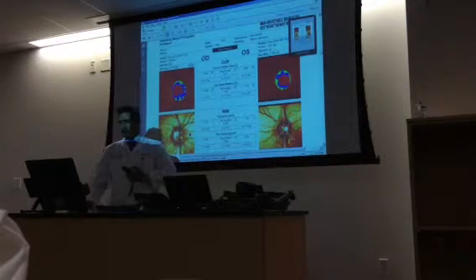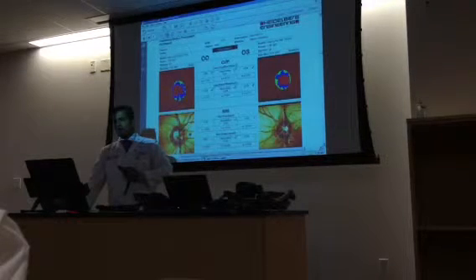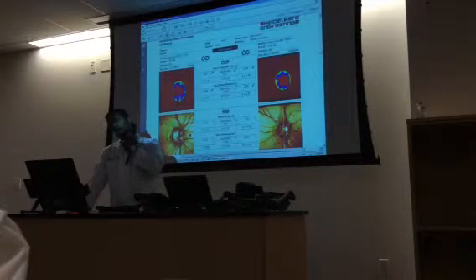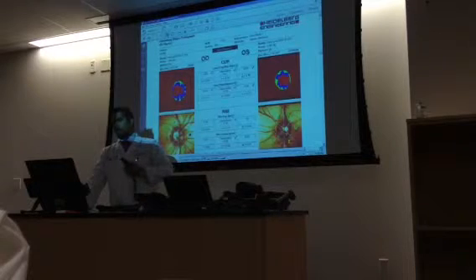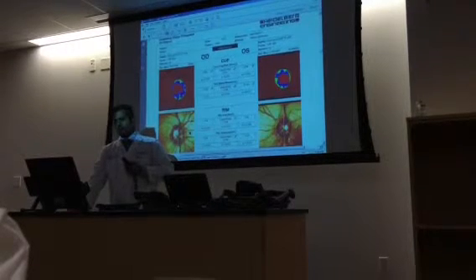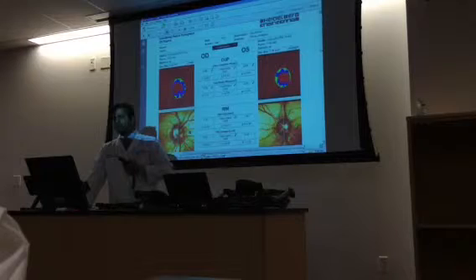Okay, so if I had to interpret this, this person is a 72, so 40-ish age. How many years? 42 years old, male. But this was examined a few years ago, so it's a different time.